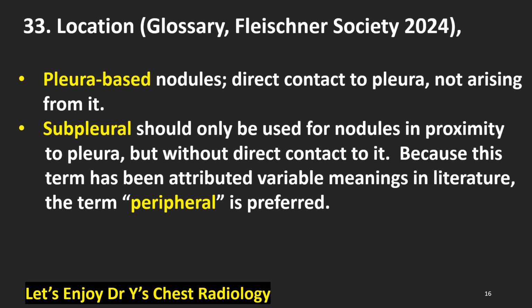Location of the nodules. Pleural-based nodules have direct contact to the pleura, not arising from the pleura. Subpleural should only be used for nodules in proximity to the pleura, but without direct contact to it. Because this term has been attributed variable meanings in the literature, the term peripheral is preferred.